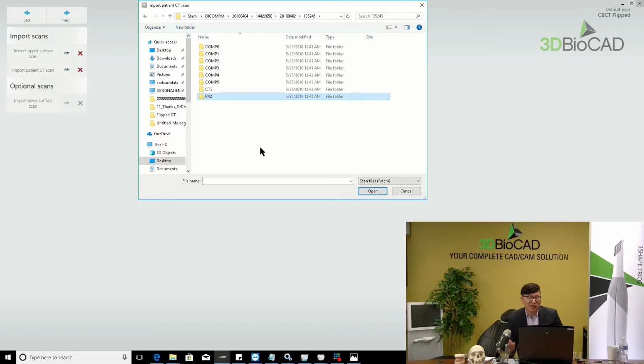But Implant Studio, please check this small button here. Okay. DCM is always the default, but we can change it to other file types. This means that DCM is the default, but Implant Studio can read a slightly different type of file, because sometimes when a CBCT machine exports the CT DICOM file, the file type is not really DCM, but actually it is DCM.